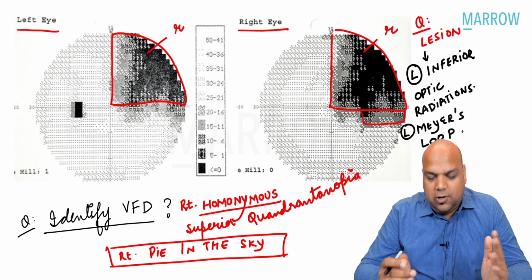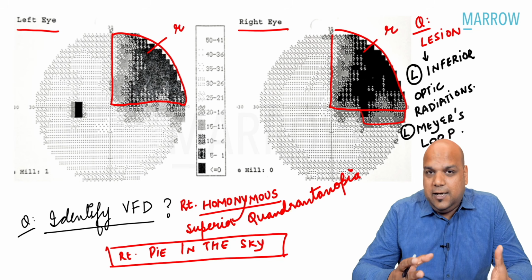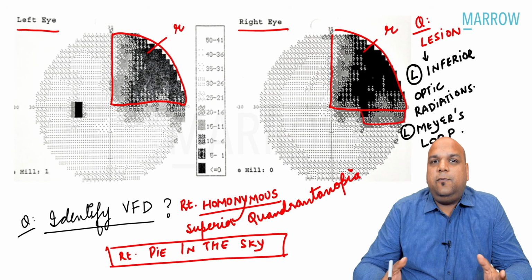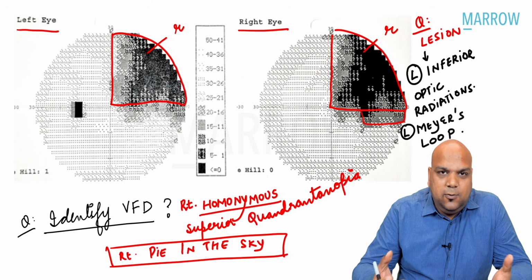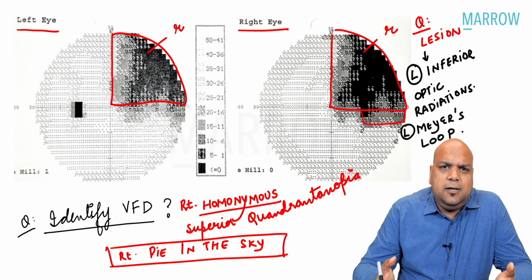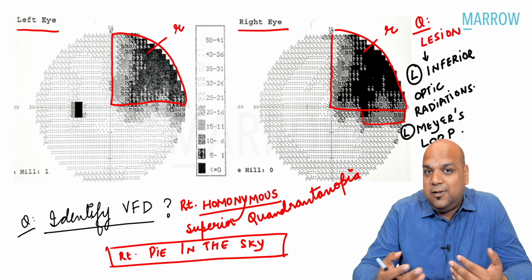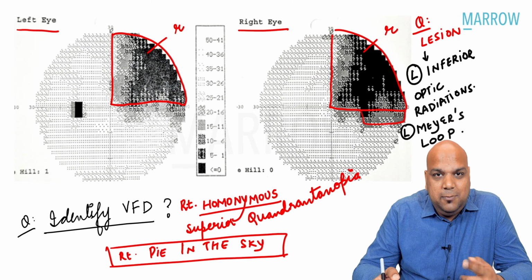I hope we are clear about how to solve such image questions. Yes, these image questions are on the rise. Now they are not asking you theory, they are just giving you a photograph and asking you to diagnose based on the report produced by the machine. I know AI has come, the machines give us the answer also, but at last you are the doctor. You should be able to confirm or deny the findings of the AI machine.